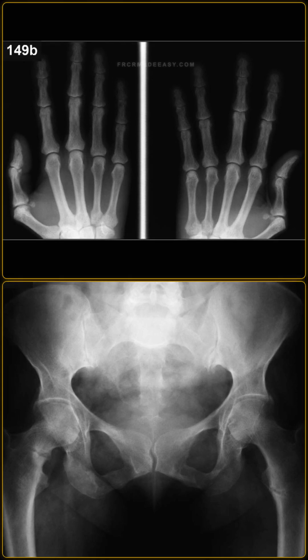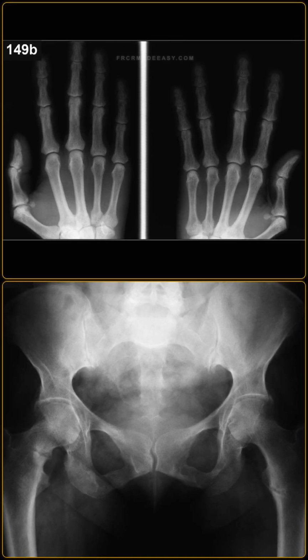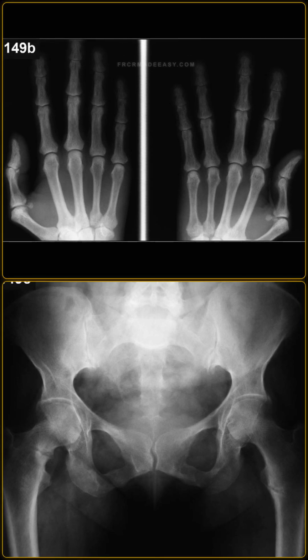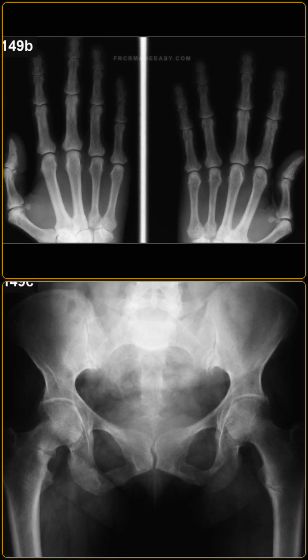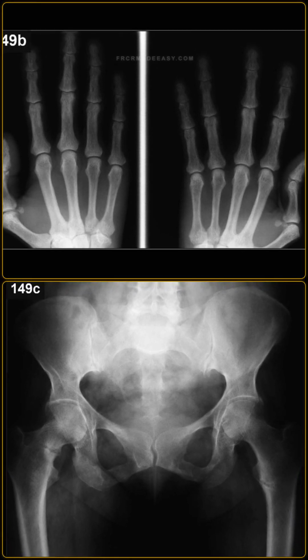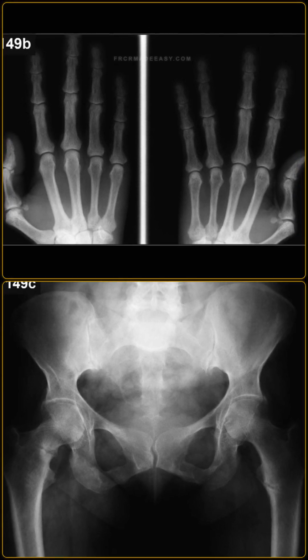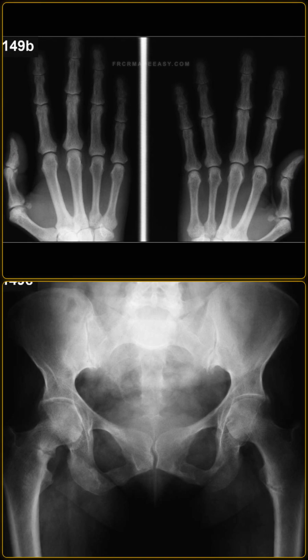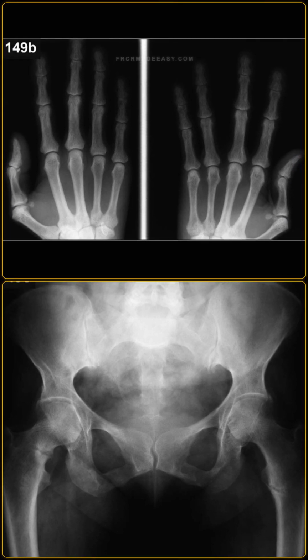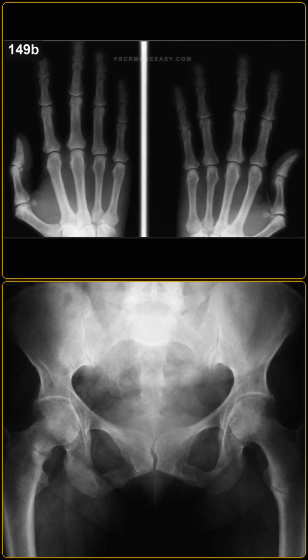The radiograph of both hands demonstrates a diffusely coarsened trabecular pattern, typical of osteomalacia. The antero-posterior pelvic radiograph shows bilateral looser zones in the femoral necks, appearing as narrow transverse lucent clefts with sclerotic margins. There is also generalized osteopenia of the pelvis and proximal femora. These findings further support the diagnosis of osteomalacia and illustrate the characteristic locations of pseudofractures in weight-bearing and stress-bearing areas of the skeleton.